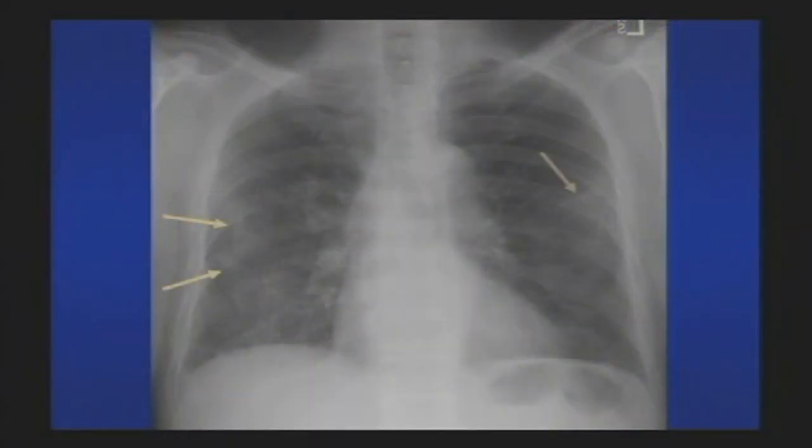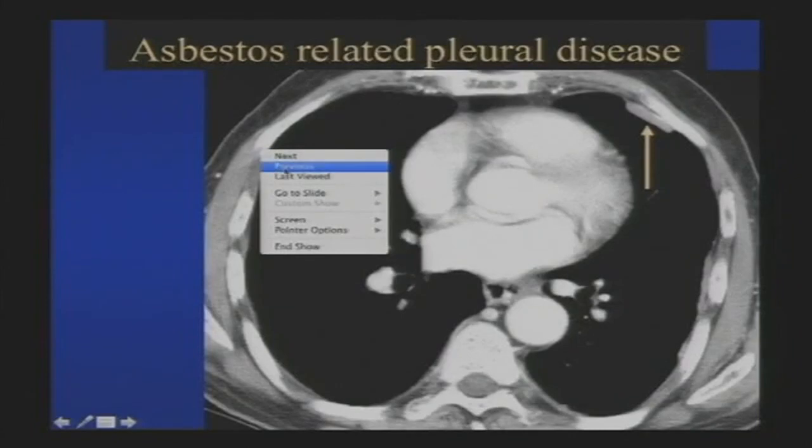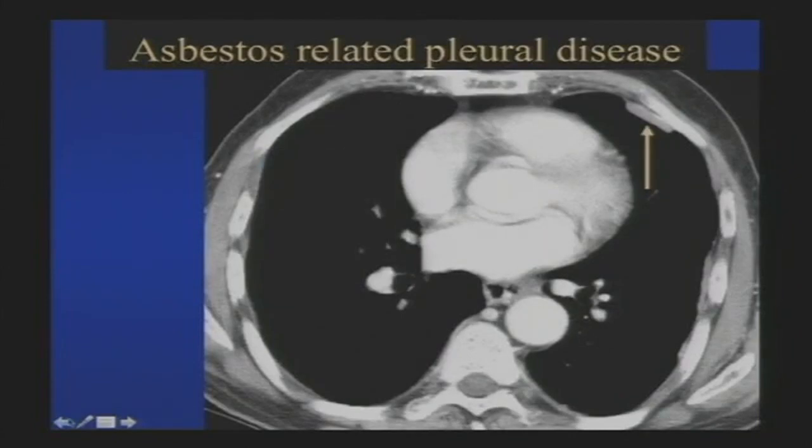Here we see multiple abnormalities, sort of overlying the mid portions of the lung. How do I know that these are pleural in nature as opposed to lung nodules? Well, this one in particular I think is a good example. One, you have some components which look pretty high density, so it makes me think that some of this is calcified. And everyone appreciate how there's a very nice border where the arrow is. All right, and the other side of it was ill-defined on the chest x-ray.